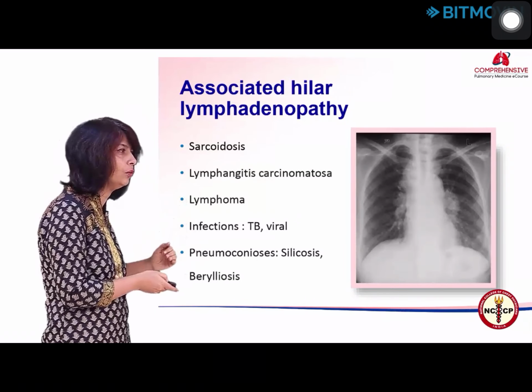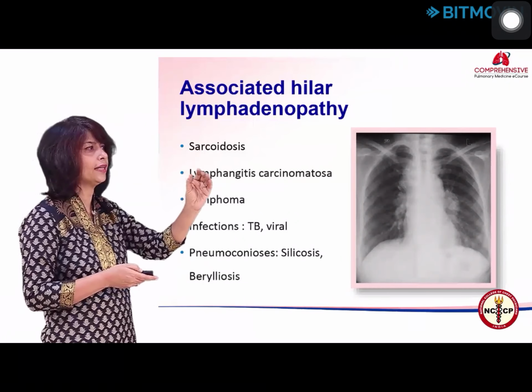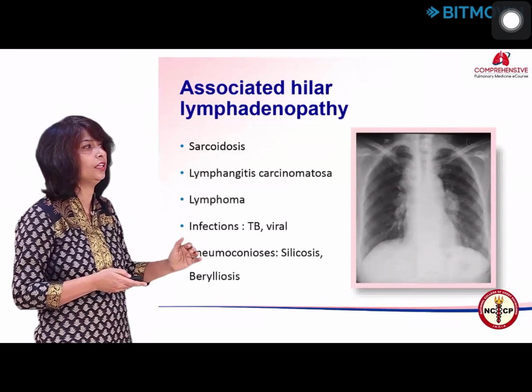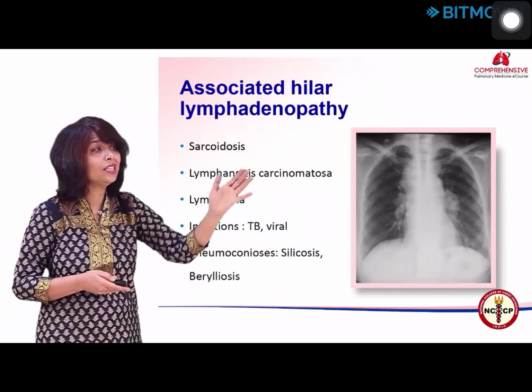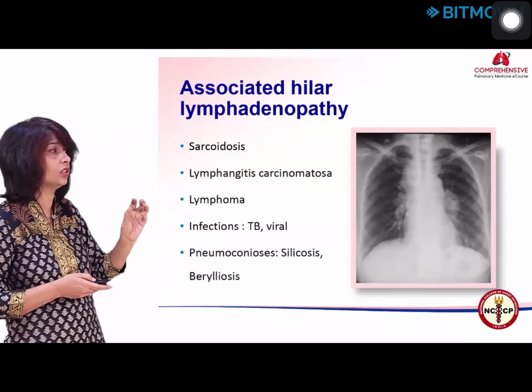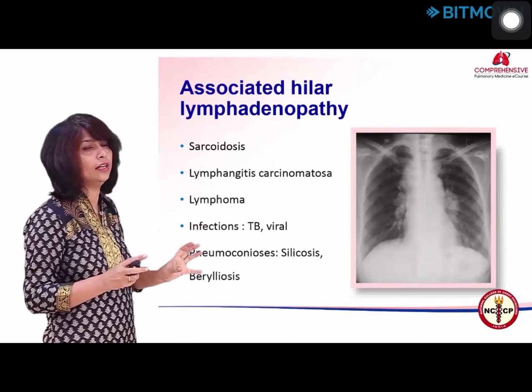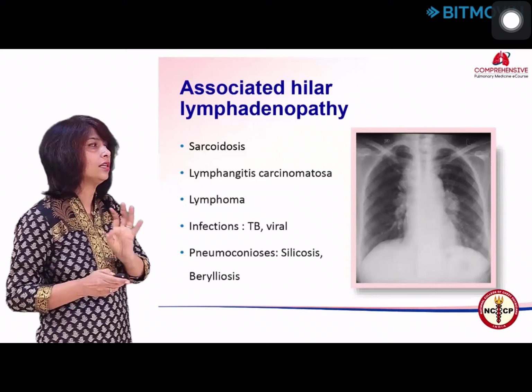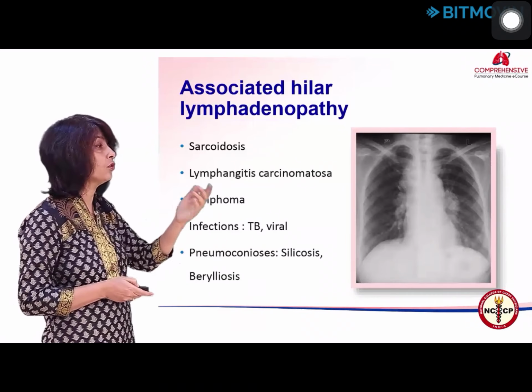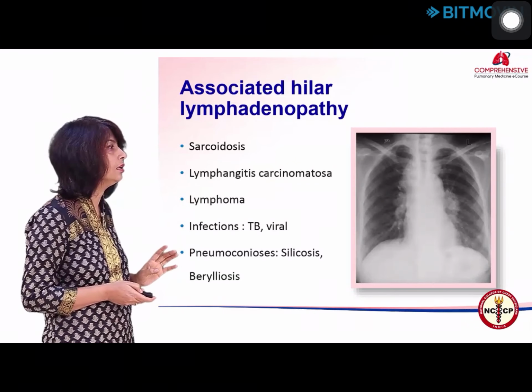You keep on following the node, the vessel keeps on looking nodular on the right side, right up to almost the level of the diaphragm. Now, this does not happen with tuberculosis, or seldom happens with tuberculosis. The bronchopulmonary node and the bilaterality really take you towards sarcoidosis. So, of course, you look for associated findings besides the lung picture.